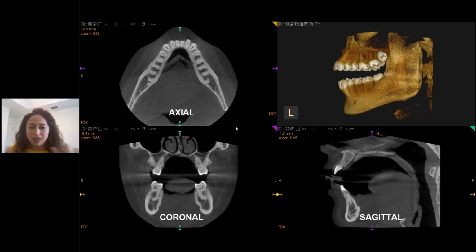So this is what we see on axial, we see axial, coronal, sagittal view. We also have the 3D rendering, which we will not use for diagnosis. We're going to use these 3 views and maybe use 3D rendering to try to recognize where we're at. So it can be overwhelming to see 3 views at the same time, not knowing where do I start from. And it's tempting to scroll on one view, see a finding, manipulate our movement handles, and go down the rabbit hole just looking at one tooth for the next 15 minutes.